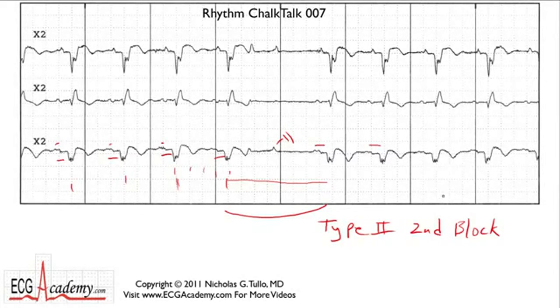Well, that's not the whole story. And we'll have to go back and talk about how to look for small details. Remember, first you look at the forest, then the trees, but it's the small details that will give you the answer every time. So what does the ECG look like? You've got this P wave that has high frequency signals because it looks kind of spiky, and then you've got T waves that have a very low frequency signal content and it looks very smooth. And if you look at these T waves, I beg your pardon, they look very smooth. And you see this one here.